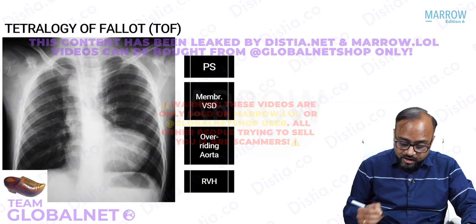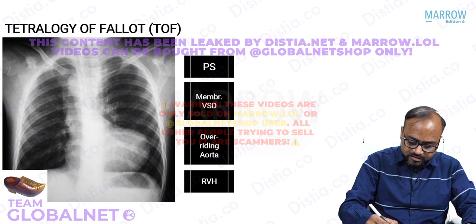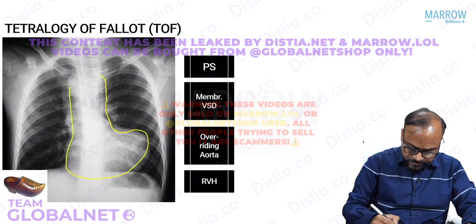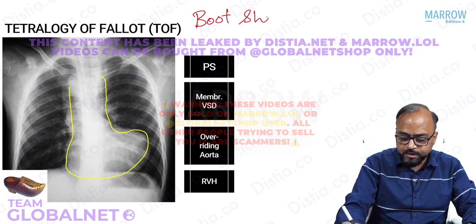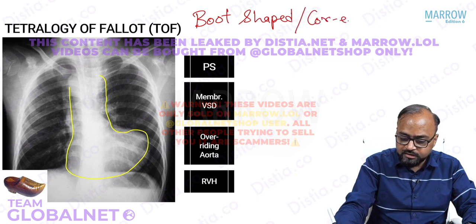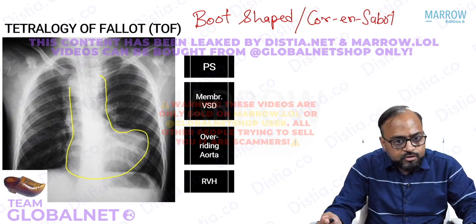Now see, a very classical shape of the heart that you can see here is the apex being turned upwards. This is called your boot-shaped heart. Boot-shaped heart or coeur en sabot, right? Now, why is there a coeur en sabot appearance or boot-shaped heart?